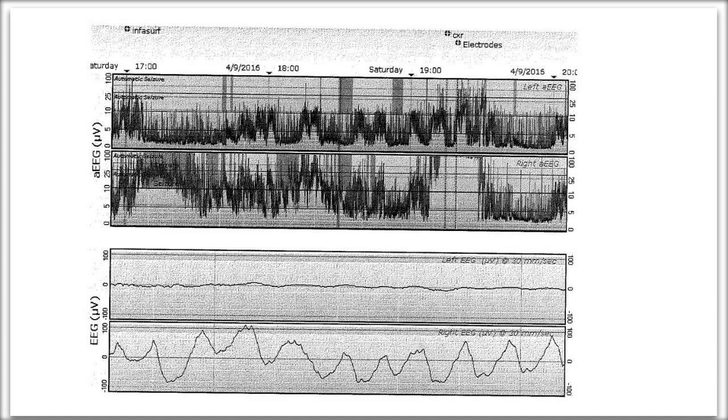So, of course, this is a preterm baby, so the type of background pattern we expect is a discontinuous pattern. We don't expect a flat tracing. We don't expect seizures, although the case itself warrants that there is a risk for seizures. And so without knowing the impedance values, it's hard to really interpret this.